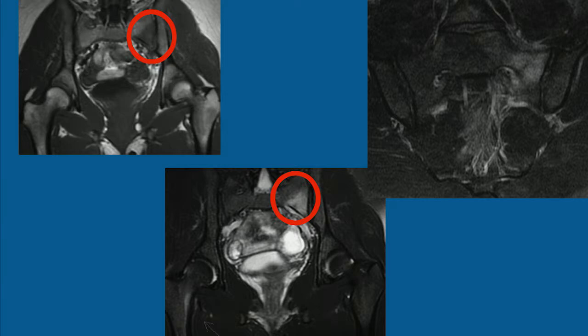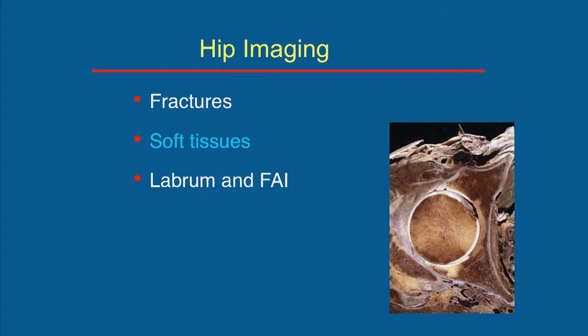The images through the sacrum, because again, we were thinking perhaps a spondyloarthropathy, show the bone marrow edema with the fracture line quite nicely. But does anybody see anything else on any of these films? Look at the image on the bottom. Do you see that focus of bone marrow edema? We just talked about stress fractures along the femur. So she has two foci of bone marrow edema in two sensitive locations. So in this dictation and our final report, we recommend, of course, that she get a bone densitometry study in addition to the diagnosis of the two fractures, that perhaps she's falling into the female athlete triad syndrome.